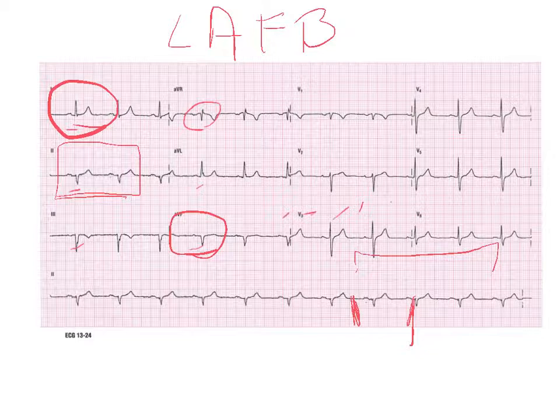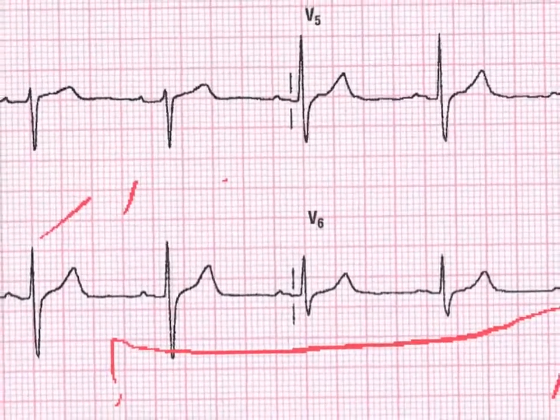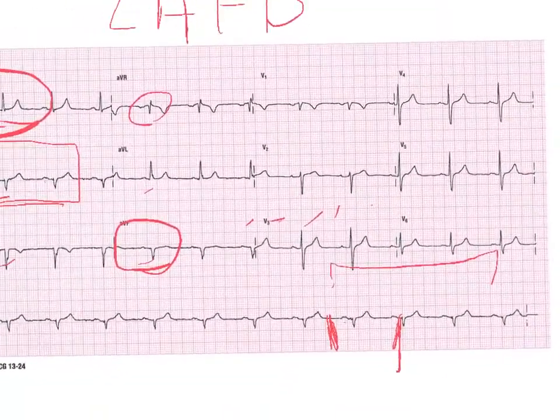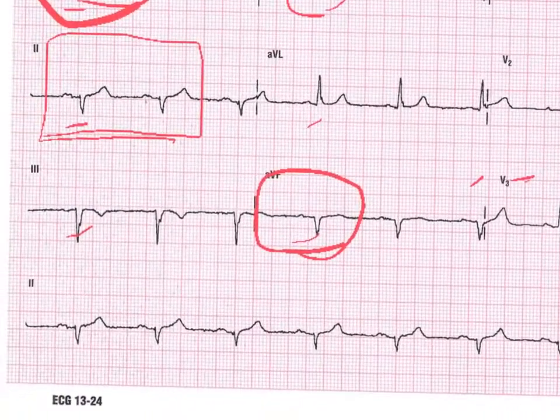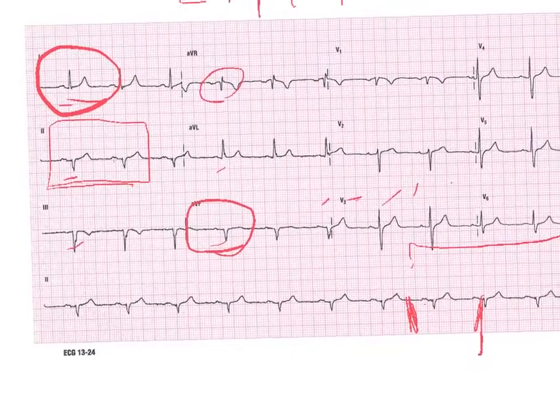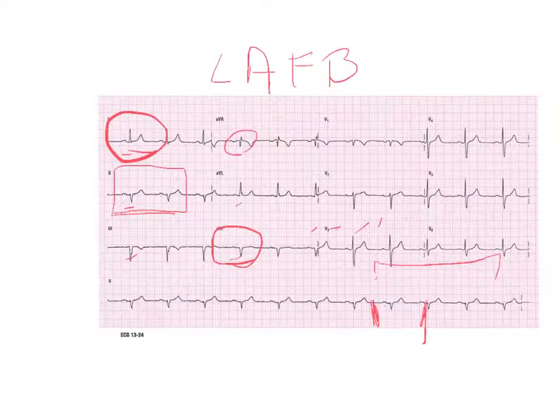We're going to look at changes. And do I see any strange looking T waves? Do I see any deformed upslope on any T waves? And I don't. Do I see any ST elevation or depression in any of the leads? And so really, I don't see anything on RPM ABC. The only abnormality in this sinus rhythm would be a left anterior fascicular block, possibly. So that's RPM ABC for case 1.